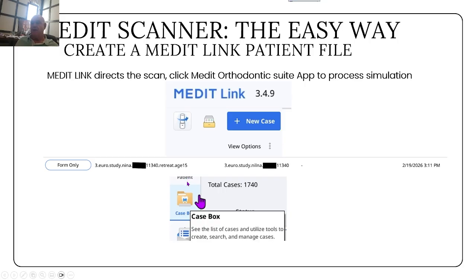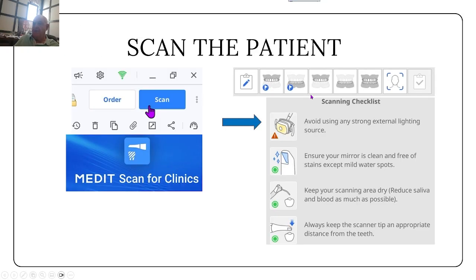That's in the left-hand column of Medit. Once you have a patient file with a name on it, you can make a scan. So you open up your patient file, you click scan, and it's pretty self-explanatory.